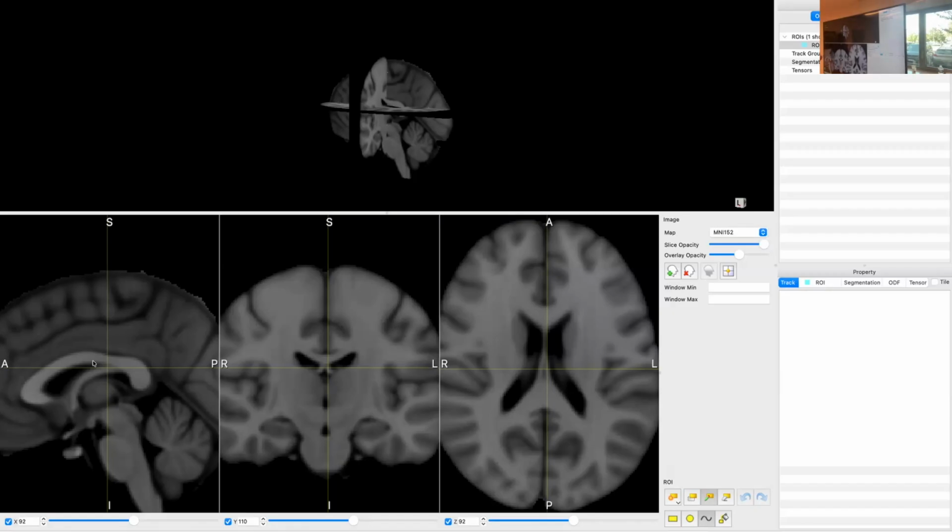Yeah. It's a tricky question because it gets classified differently. Because in this part, it has a longitudinal orientation, but then it branches down and it splits, which is when it's often classified as a projection tract. But also in the middle, it's one tract. So it sometimes gets picked up as a commissural tract, even though the orientation is longitudinal. It's a slightly tricky question. But the point is we need to stay clear of the fornix, because if you include it in your region of interest, you also get the fornix.